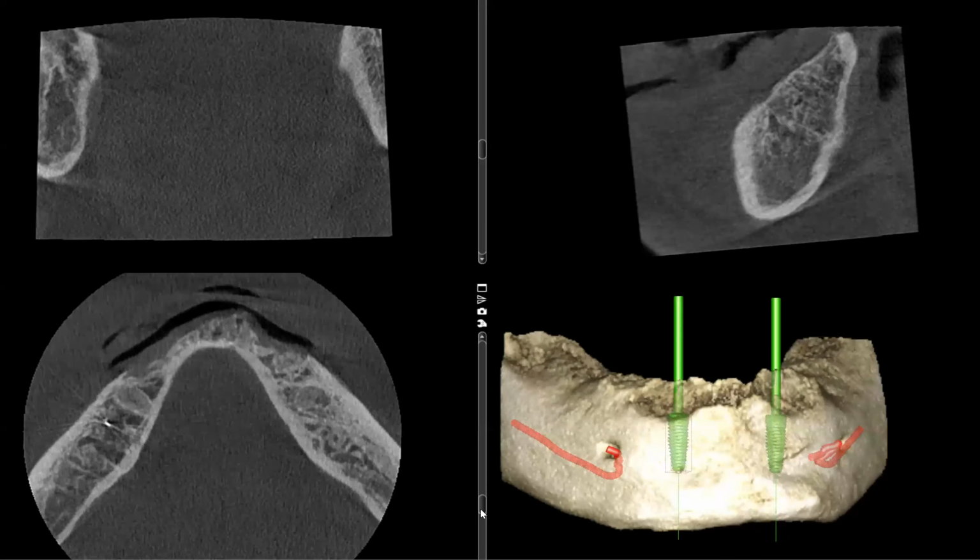Relatively no specific findings. So I was going to sign that case out. But remember that it's important for you to look through the entire area of the scan, not just the areas that have been planned for dental implants. And I hope I emphasize it enough in many of my videos that I've made so far. This is a good example of why getting in the habit of looking at the rest of the scan thoroughly can really make a difference in certain cases.